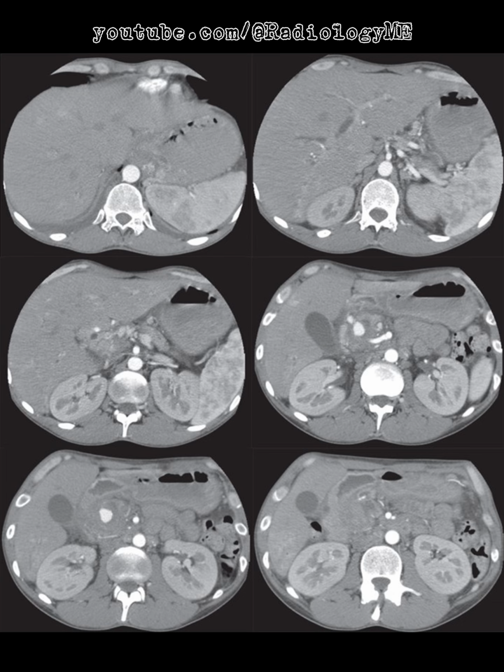In terms of anticipating potential questions, I'd expect the examiners to ask about the vascular anatomy here, why this region, how we interpret the enhancement, and the steps we'd take next. They might also push for alternative diagnoses if pancreatitis wasn't in the clinical history. And they'd likely want me to explain the role of further imaging or interventional techniques, especially in managing the case safely and effectively. I'd wrap this up by highlighting that cases like this demonstrate the crucial role radiology plays in both diagnosis and decision-making for potential emergencies.